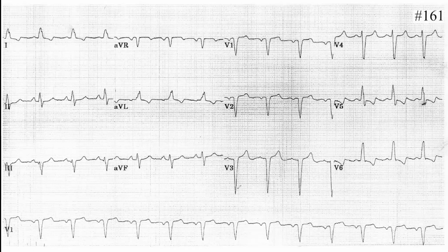Okay, and then we have P waves followed by QRS. The P wave is pointed if it's more than 2.5 millimeters, but I think it's not more than 2.5 millimeters. So that's still in the normal interval. If it's high, it should be around 3 or 4 millimeters, a very big and tall one. It's upright in lead 2 and inverted in AVR. So it's a sinus rhythm. Okay, very good.